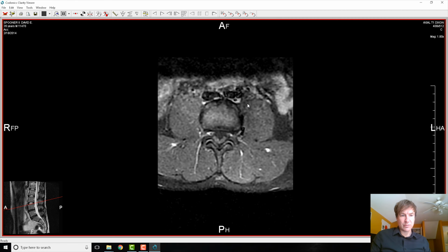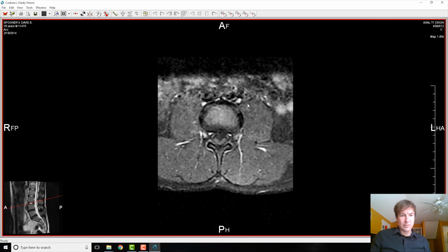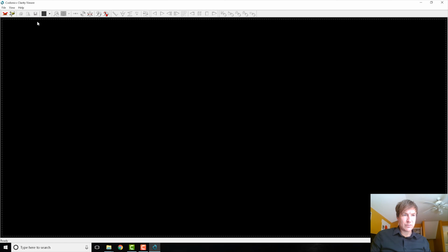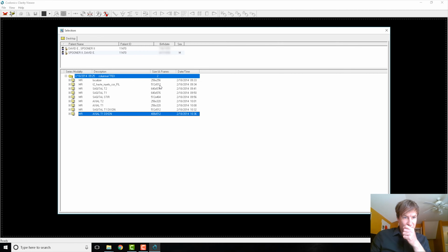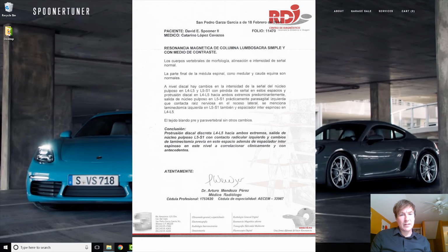I'm sorry, I'll start that L3, L4 disc again. Yeah, that's it. Close that out. I think that's it for this 2014. So let's go to the next one, which is going to be 2016.